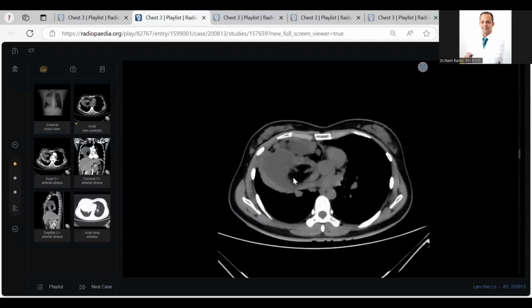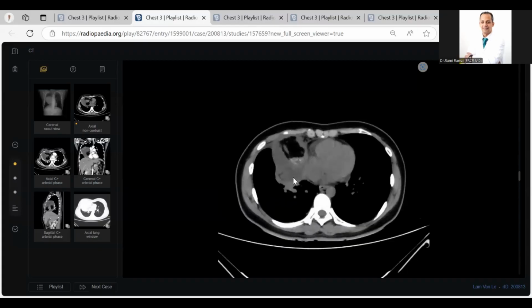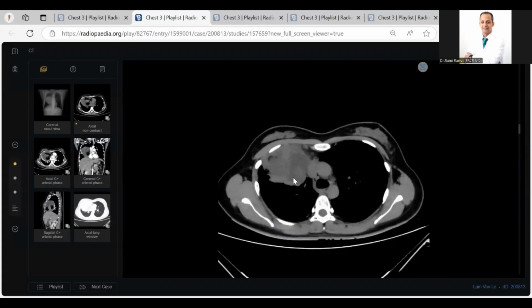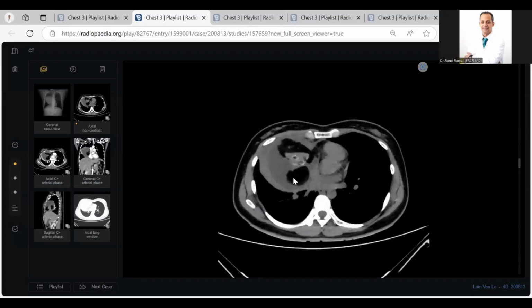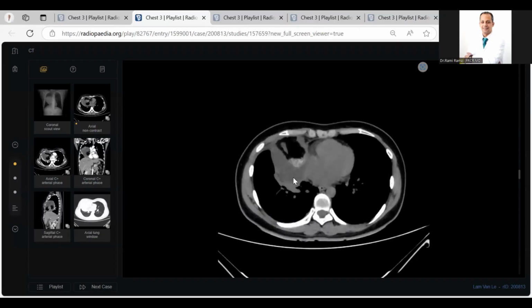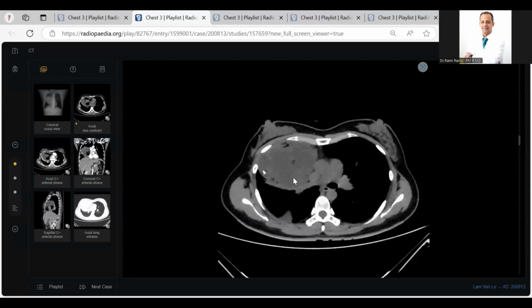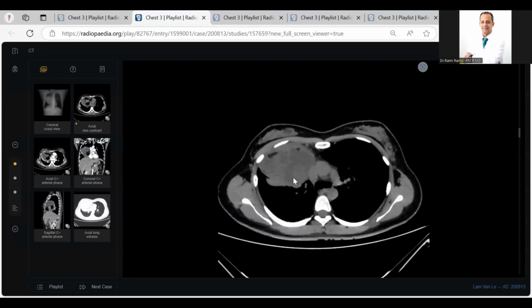However, if you wanted to get 8 out of 8, tell him: however, I couldn't detect any pleural metastasis or pericardial metastasis. So it is mostly mature teratoma. My differential diagnosis would include thymolipoma; lymphoma is not a possibility. Like this, you close the case in 2 to 3 minutes maximum. The examiner will be happy.